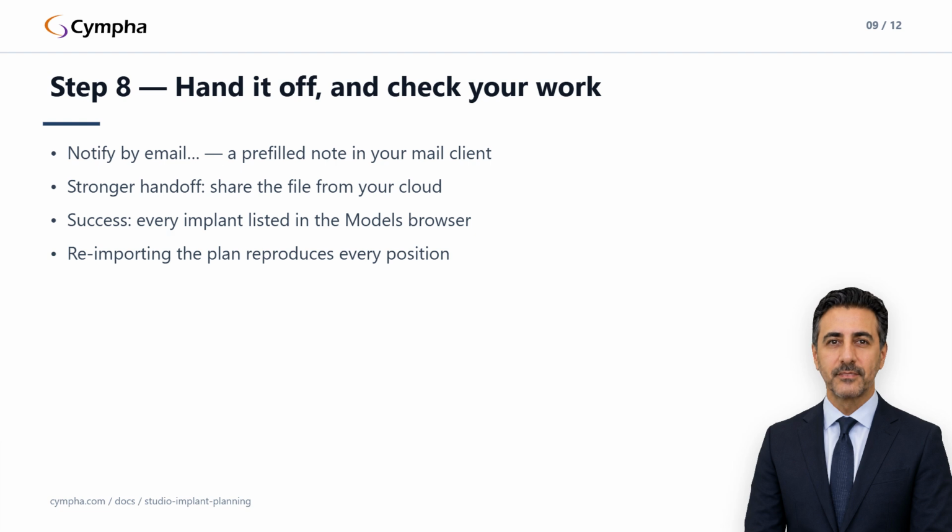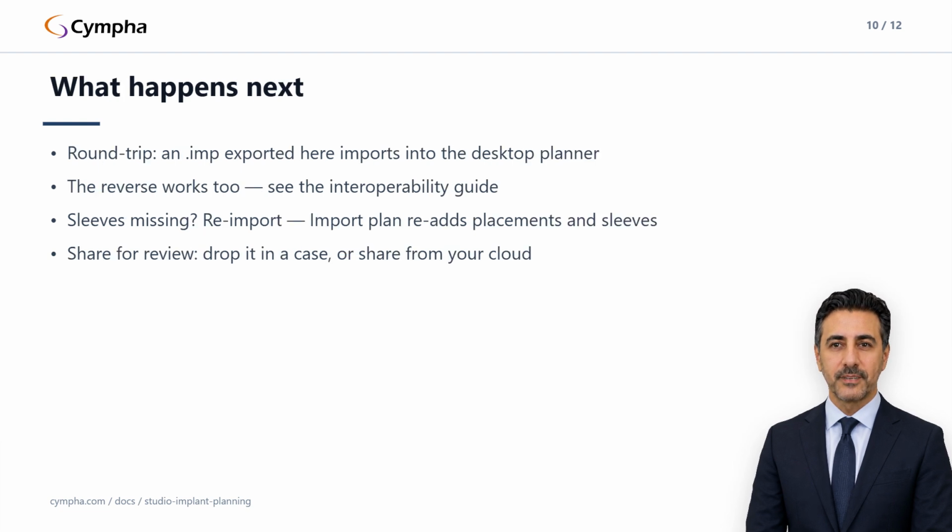And third, sharing for review. You can drop the plan file into a Cympha case or share it directly from your cloud folder. Both paths preserve exactly the same metadata, so whoever opens it sees precisely what you saved. Six things commonly push back, so let's take them three at a time.